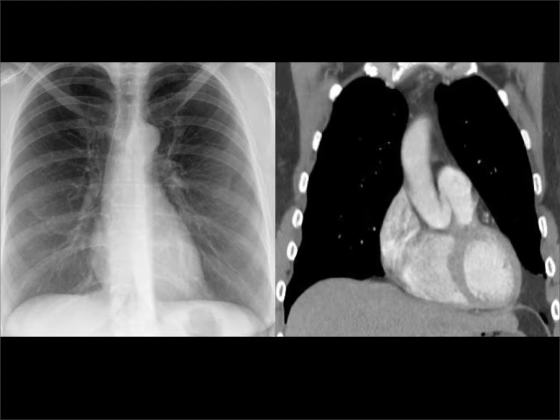And here's just to show them on a CT scan. So here we are, right atrium. Right ventricle is in here. Left ventricle is here, forming that border. Left atrium we don't see on this, just a little tiny bit of the left atrial appendage sneaking through here. This is the pulmonary artery. And here is the ascending aorta. We don't see the ascending aorta border on the radiograph because it has no interface with lung. It's only got interface with soft tissue.